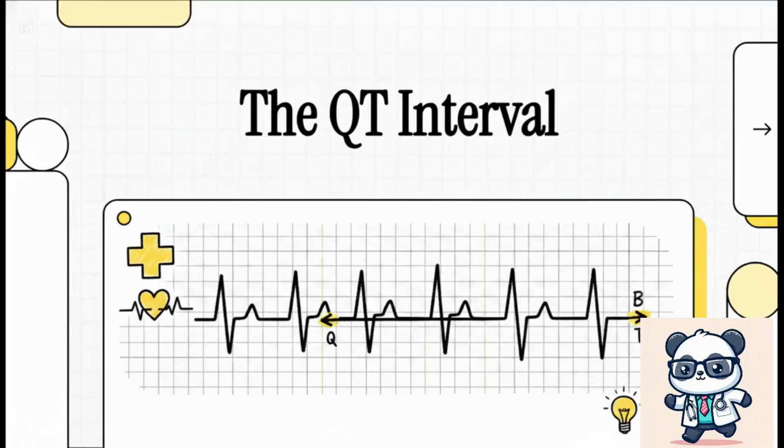Welcome to this clinical explainer. Today, we're breaking down the QT interval on an ECG. It's literally just a tiny space on the grid, but getting this one measurement right can absolutely mean the difference between life and death for your patient.